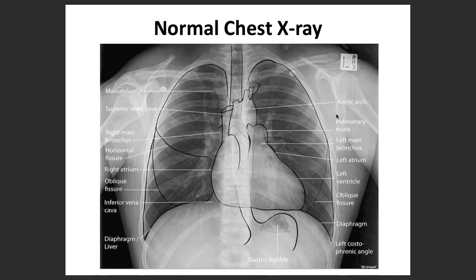So now in the airway, there are a lot of airways and other structures which you can see over here. Most of these structures are already named, such as the cardiac shadows and the different areas you can notice.